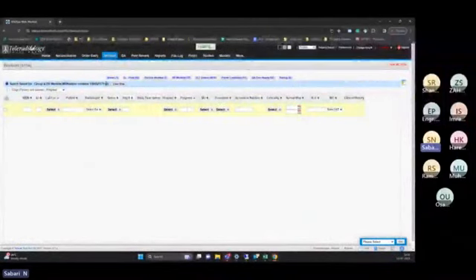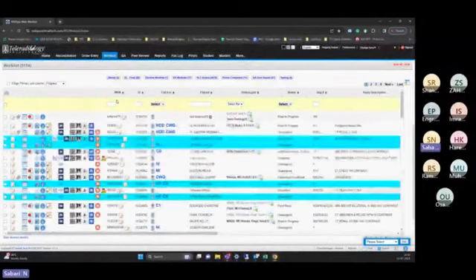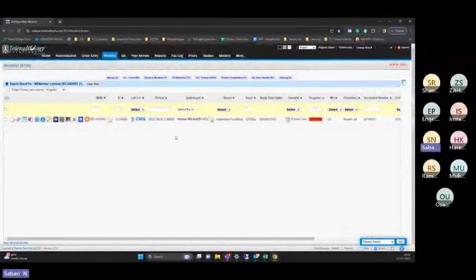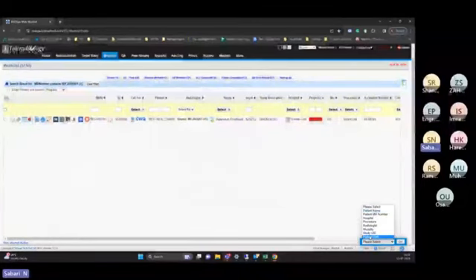One second, I added an extra space. Okay. So if I want to search a particular patient, let me take this patient. Just copy and put the MRN number and press enter. It will search only the patient from the screen. This is a global search. So here also you can search by patient, study ID, modality, patient name, medical record number and everything.